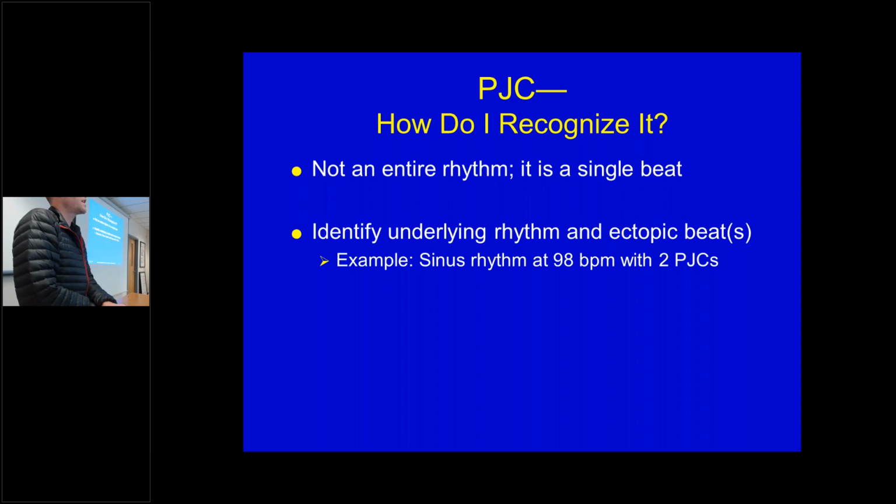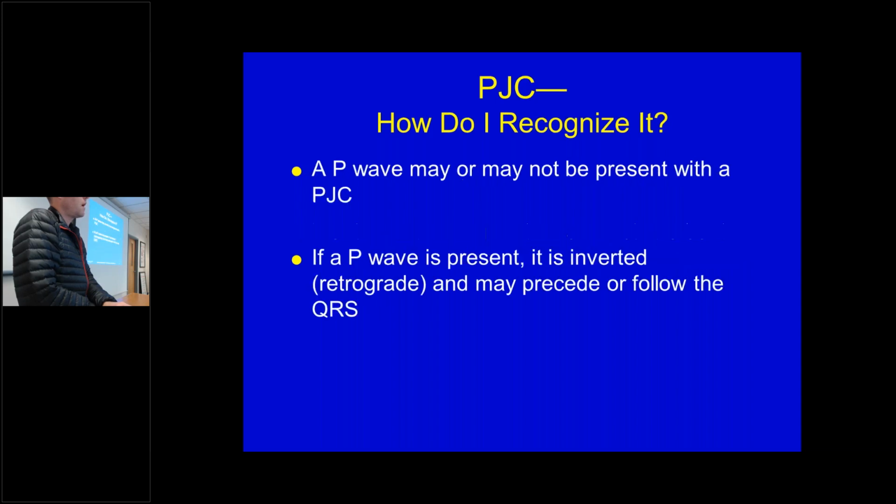So a PJC, just like the PAC, is not a full rhythm. It's just a single intermittent beat. So it can happen before or after, but not during? Yeah, it could still be during. During. Yeah.